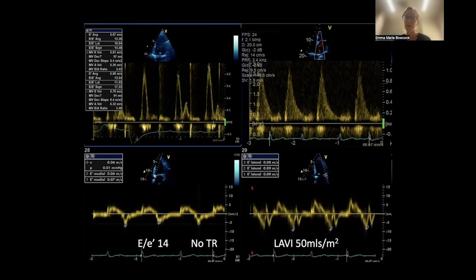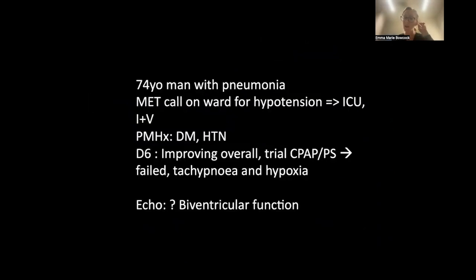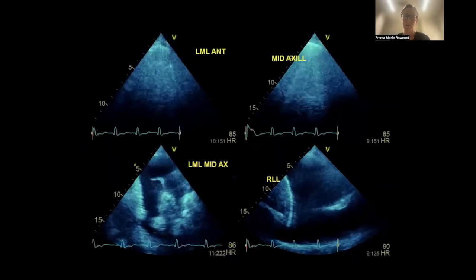And if that's more than 2, you go straight down that arm of likely raised left atrial pressure, and combine that with the fixed bowing of the intra-atrial septum to the right, and the clinical history, what you're dealing with, which is weaning failure. You're very likely to be dealing with it, right? So it's about bringing back in, and this is what they'll want you to do in the Viva, Ravi, the clinical context. Yes. So you've got failure of weaning, and we know that one of the relatively common causes of failing to wean in the ICU is diastolic dysfunction, isn't it? So it's about bringing that in. I think it might be a little bit mean to give you a case like that, but I think it's still a good one.